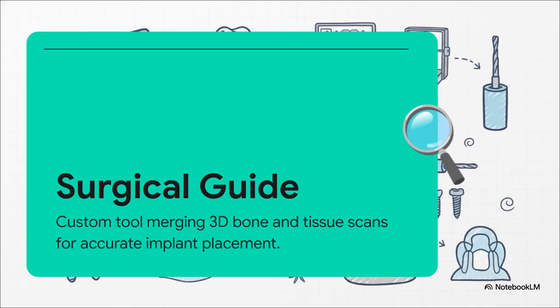Millimeter-accurate implant placement. During this initial data acquisition phase, we're taking a CBCT scan, right? Which captures the jaw in 3 dimensions, so it shows us the bone contours, the sinus floor height, and, crucially, nerve canal locations. But we definitely don't stop there. Modern workflows combine that bone data with intraoral digital scans that map out the exact tooth positions and the soft tissue contours. Through a process called surface registration, these 2 completely different data sets are merged into one unified 3D model. We're basically creating a perfect, working digital clone of the patient's mouth.